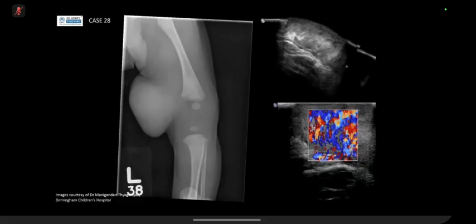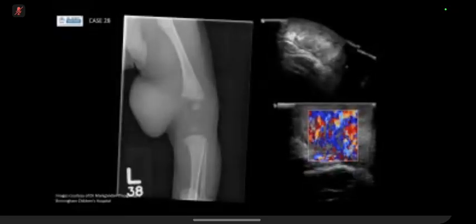So this is a soft tissue mass for which an ultrasound is performed. The ultrasound is showing that it's heterogeneous, predominantly a hyperechoic area with increased vascularity. If it was compressible during the ultrasound, then this could be a hemangioma. Okay.